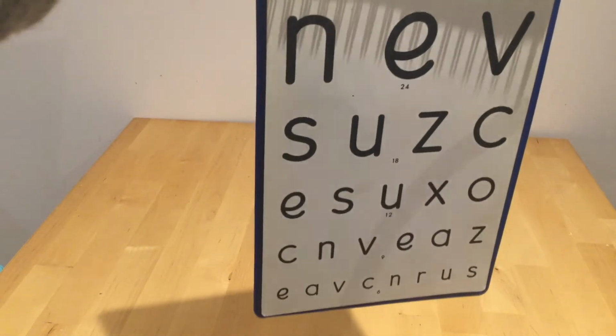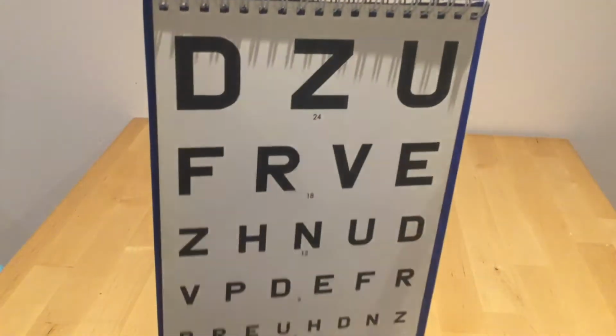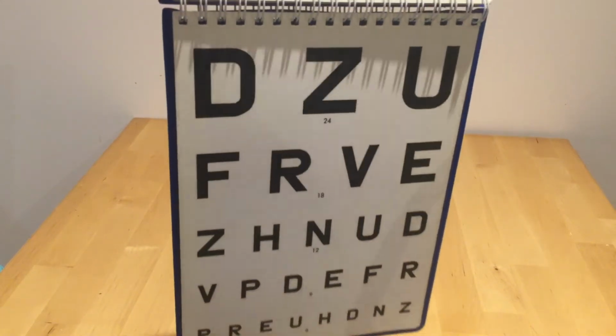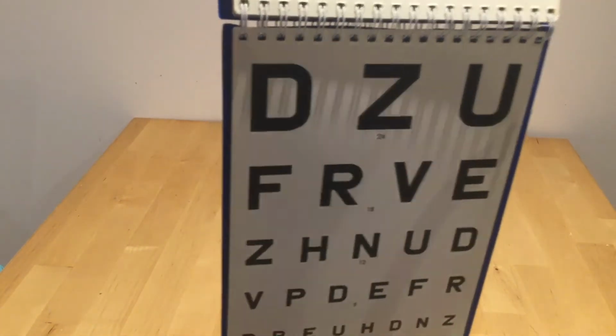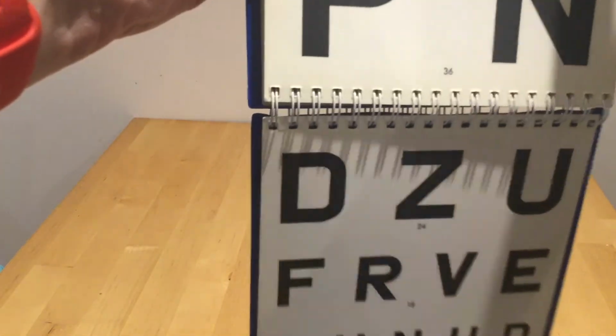Now if you flip the page over, you will find that you've got another test and it's all written in capital letters. So the first test was written in more child-friendly script. I think that would be a good way to describe it. There we go. Not easy to get it into shot, but there we are.